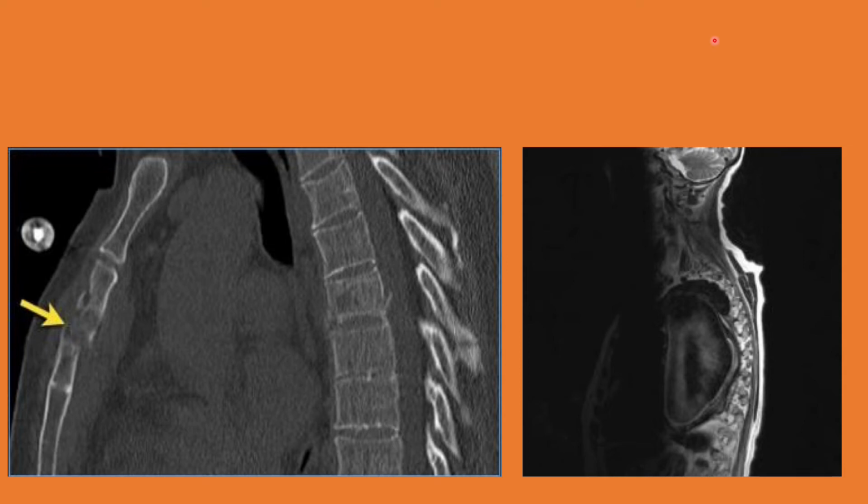So that actually concludes how you interpret a cervical spine MRI. So basically you go through 5 easy steps, which is A, B, C, D, and E. A is for alignment. B is for bone. You look at either fractures or some signal changes, which can signify either an infection or sometimes even a tumor. C is for cord or canal. D is for disc, and E is for everything else.